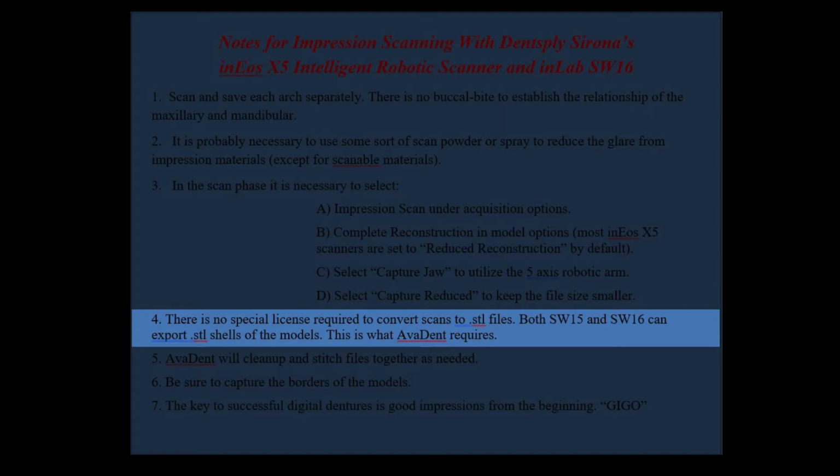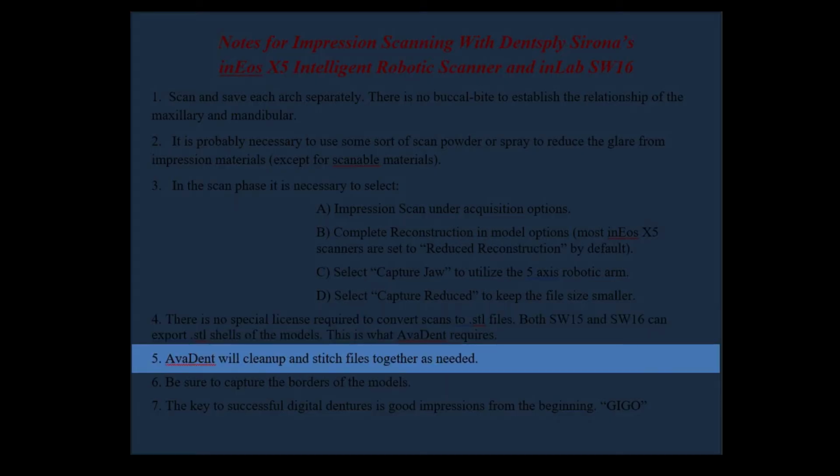Number 4, there's no special license needed in software 15 or 16 to export the STL model shells. They're not good for printing, but for what AvaDent needs, they work perfect. Number 5, remember that AvaDent will clean up and stitch the files together as needed. Don't worry if you have some extra material showing from the impression. They know exactly what they need, and they'll clean it up for you.